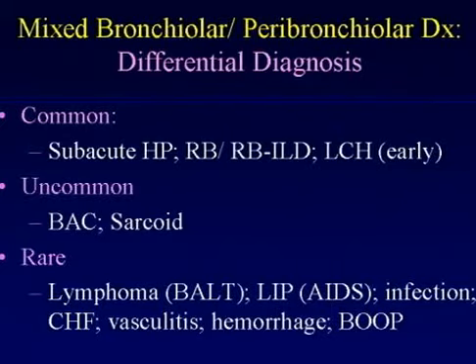This is a very trendy thing to talk about. It's a smoking-related disease. And very early on, with respiratory bronchiolitis, what you'll see on a CT scan are a few, and I mean few, poorly defined ground glass nodules, centrilobular nodules in the upper lobes. And you'll wonder whether or not you're dealing with something called AAH, or atypical adenomatous hyperplasia, or you won't even think anything at all about them, and that's probably a good thing, because they just mean that you're dealing with a smoker, and it probably shouldn't be overread.